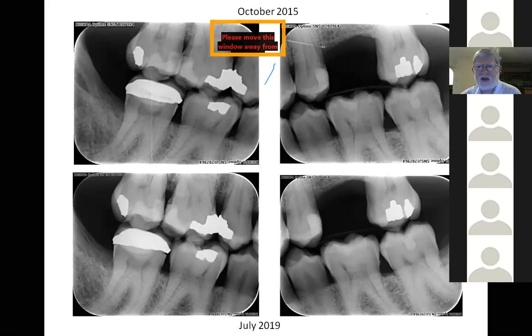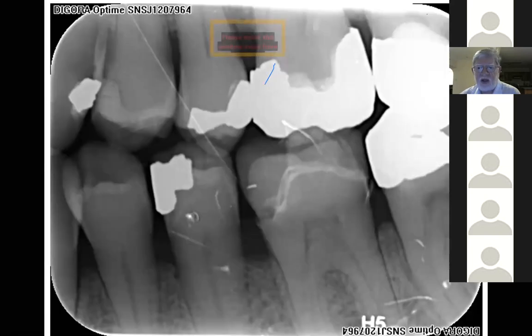This was again radiographs just showing how, when you're taking your bite wings, you are taking them consistently the same way every time. Okay, issues here. What are people seeing on this radiograph so far?